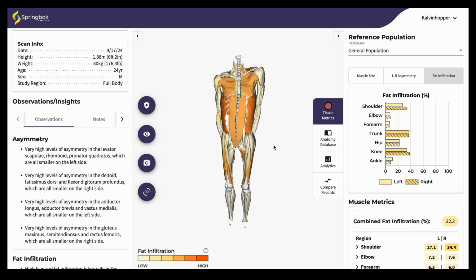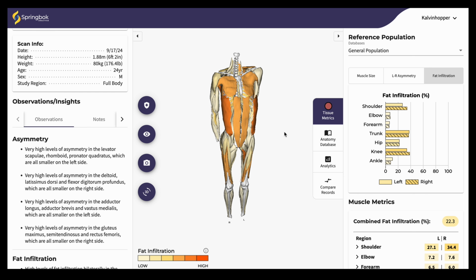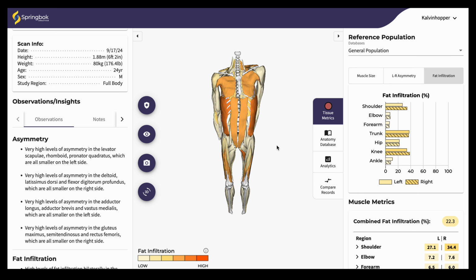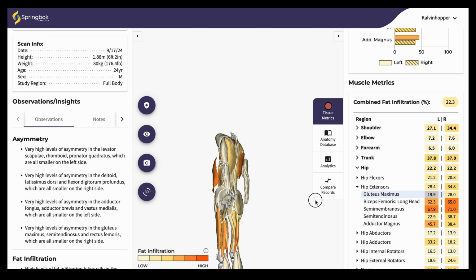I think usually there's a bit of correlation with muscles that are the most affected and how infiltrated with fat they are. So that makes sense, you know, shoulder, chest, lats. They're all muscles that aren't super strong for me. So let's dive a little bit deeper. Let's have a look. Where's a bad one?